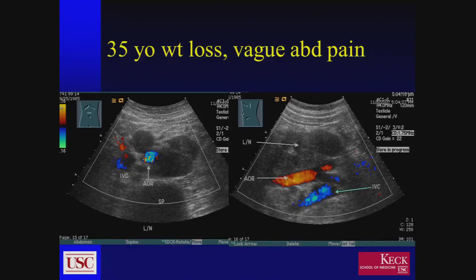One thing to keep in mind, I think a lot of times we depend so much on CT when it comes to retroperitoneal masses. We forget about ultrasound, but certainly when we're looking at the retroperitoneum, we can, particularly in thinner patients, get very good images of what's going on. I think Ulrike showed a case yesterday, or Leslie, of the floating aorta, but in this particular case, this is the sonographic version of it.